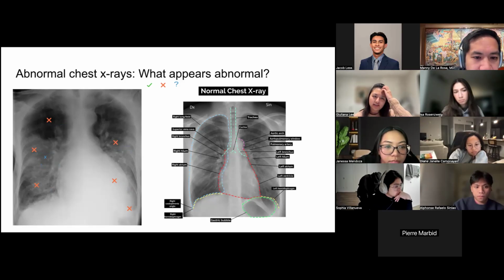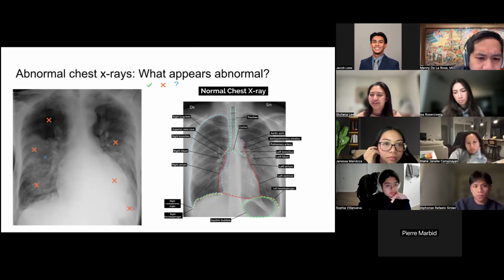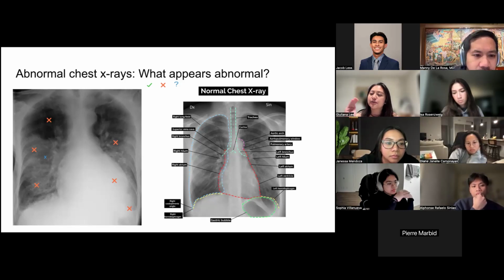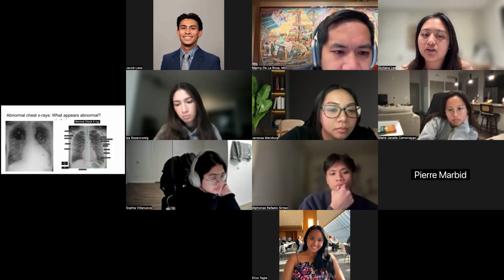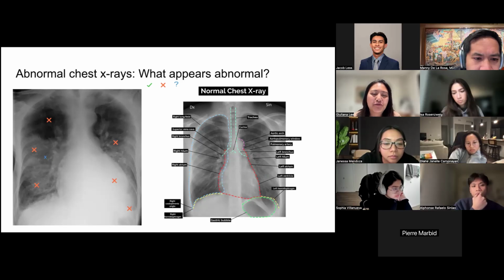Amazing. We've got some great stuff. So we're going to stay on this slide. And before we move to the next slide, we've got about 4 or 5-ish cases. So honestly, it's great practice, especially for those who are on the wards, to just practice reading a chest x-ray out loud. Oftentimes your senior resident or attending will just say, "What do you see?" And I feel like going through a systematic approach can be really helpful to demonstrate your knowledge and also just practice yourself. So is anyone brave, wanting to go through the ABCDE approach, maybe using these X's as their guide?